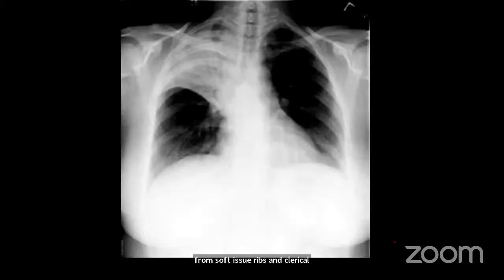Right? So after having discussed all these things in brief, I'll now come to X-ray interpretation and some diseases. All of you can just see this X-ray and write down what it is, and then I'll go ahead. So this is actually consolidation.